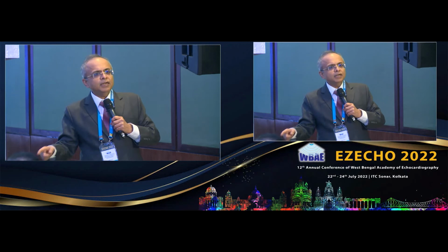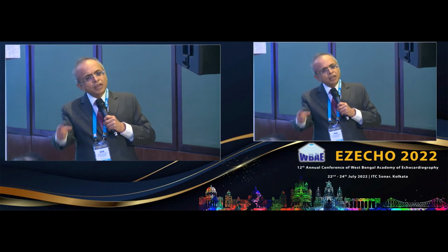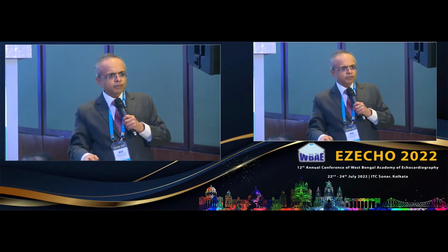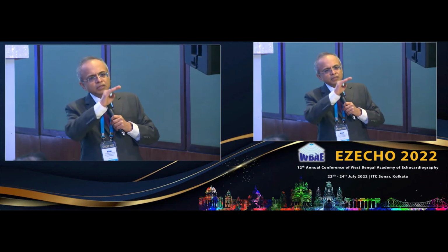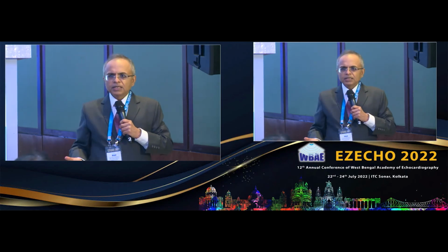And on the mitral side, look at the E deceleration time. Though gradients are high, if E deceleration time is fast, that means you are missing a paravalvular leak. Then you search for that paravalvular leak on a TEE or something. Also, if the E deceleration time looks as if it's a mitral stenosis, then you know that he has a stenosis.